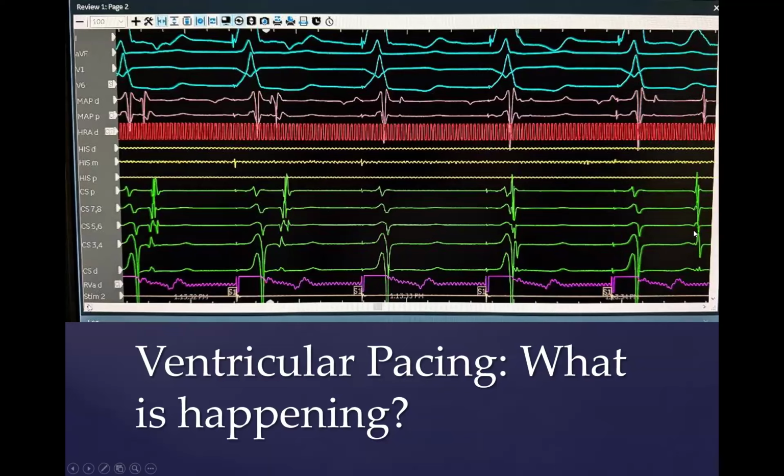I agree with you, these are A's. What do you think these A's are? Are these retrograde A's? What happens in the atrium normally in human beings?